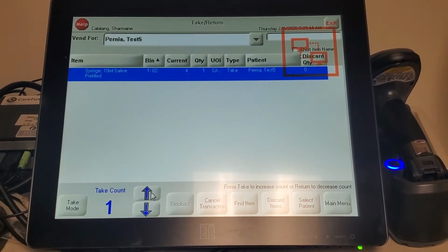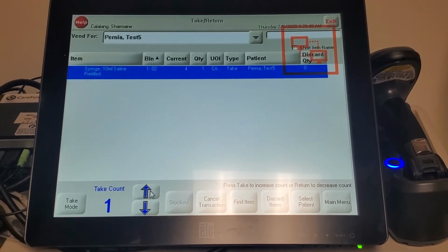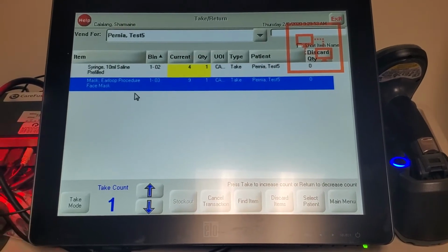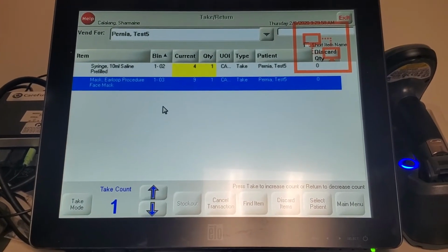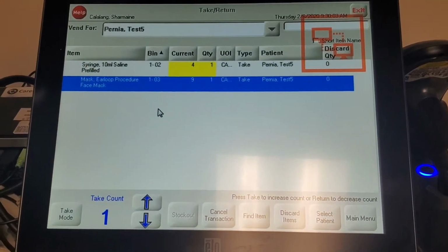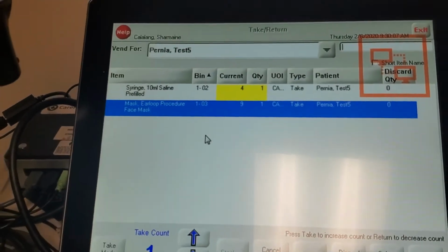Yeah, I did too. You did? I scanned that. Can I try another one? Sure. So we have that sample on the bank paper because this one is not set up yet. But once it's already set up, good, it's contained. No, it's okay, it's okay.